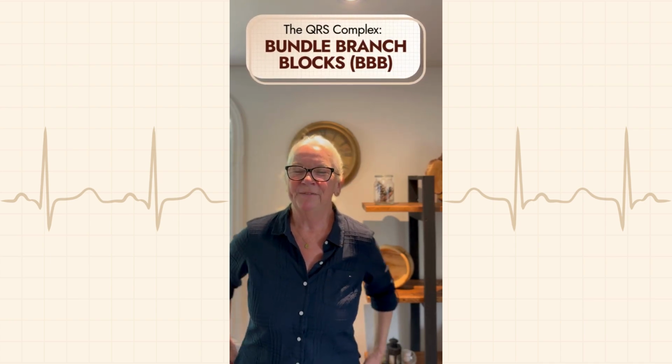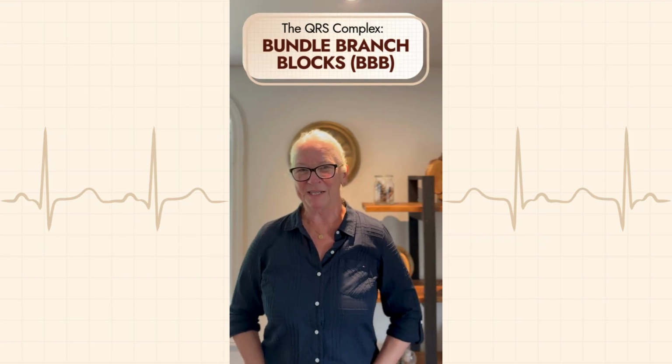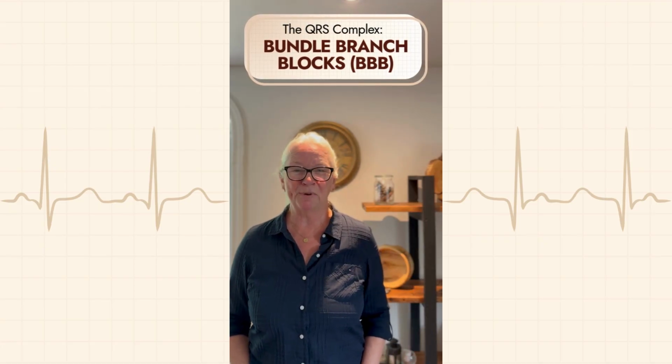In this section of the YouTube video on QRS Complex, we're going to be looking at bundle branch block.